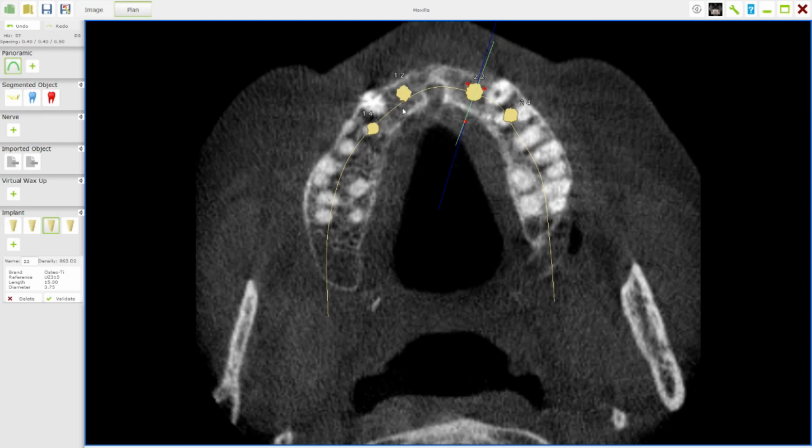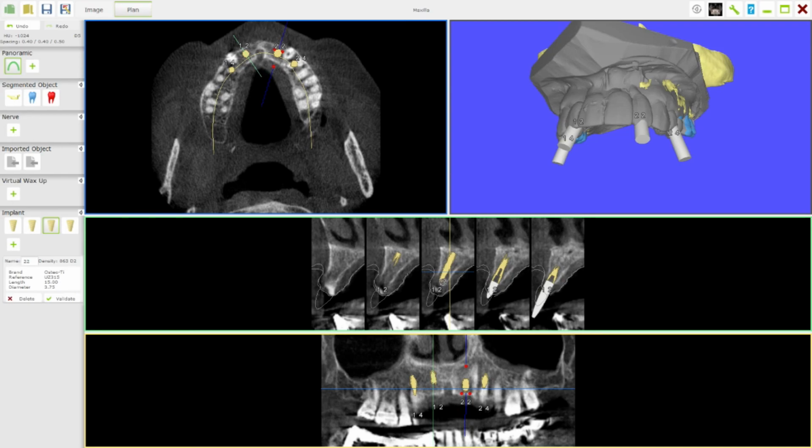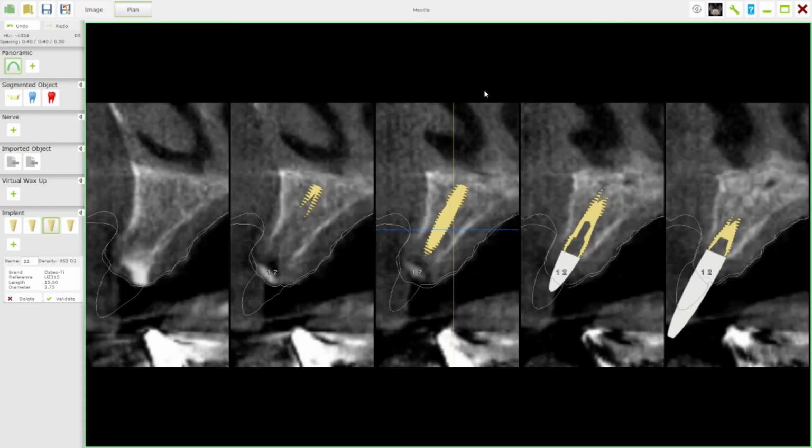If I click on the bone in that area, I can change the green, and now obviously I would be doing a transverse section through there. If I come out of this view by clicking the space bar and go to the transverse section, which is screen 2 here, again we can see the slice and how that implant is looking in the transverse section.